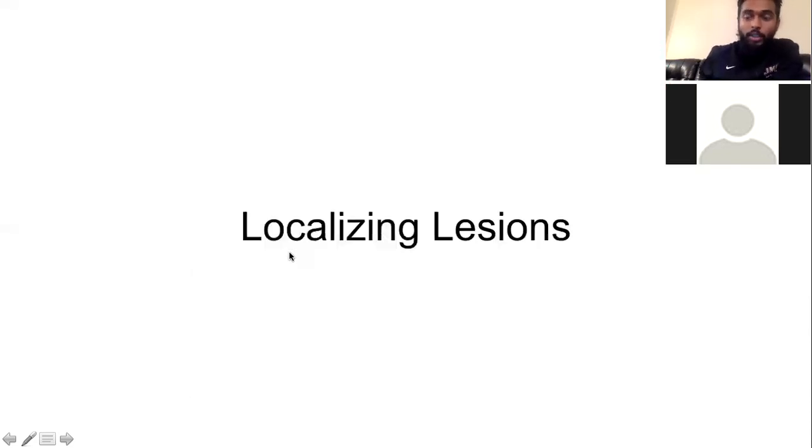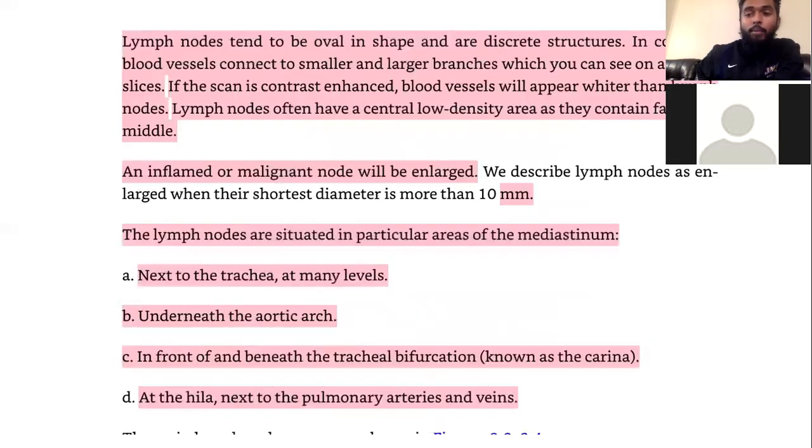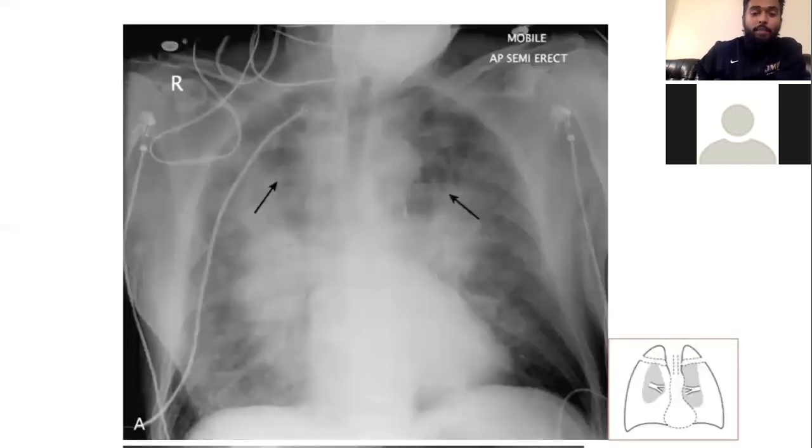But in pulmonary edema, where do you think the fluid that's leaking out of the capillaries is going to accumulate, top or down? The bottom, right? Because the fluid sinks. So in this case, there's more fluid down here, so this is a hypoxic region. In pulmonary edema, if you see vessels at the top of the lung look equally dilated or equally prominent as vessels down below, or even more dilated, that's pulmonary edema, because there's fluid accumulating down below. They're hypoxic. Normally the vessels down at the bottom would be the more prominent ones.